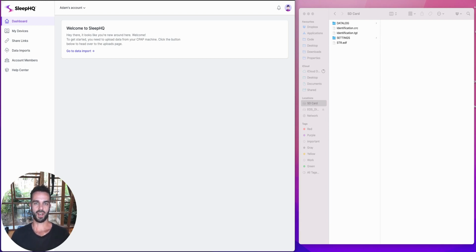Today I'm going to be showing you how to get your data from your CPAP machine into SleepHQ. To start off with, I've created a new account on SleepHQ and I'm logged in my browser over here.